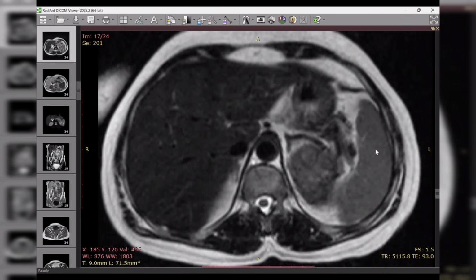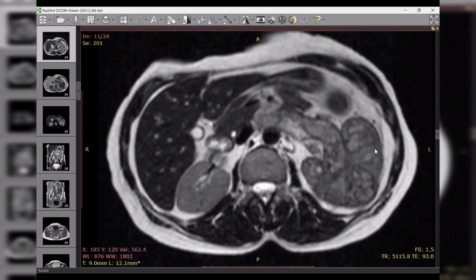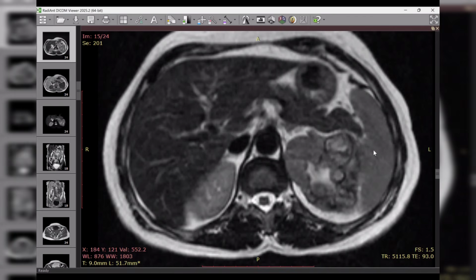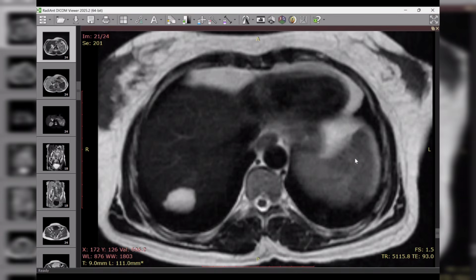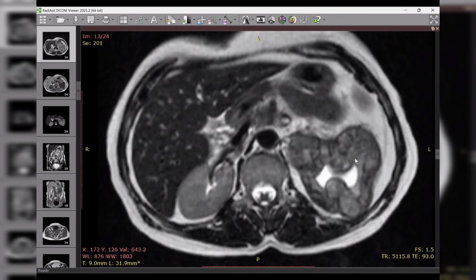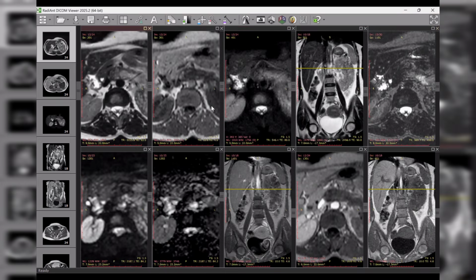These masses are suggestive of some neoplastic disease process, such as a primary neoplastic mass lesion, or it could be due to some infiltrative disorder such as lymphoma. I will also see the coronal images and the T1 images. Okay, can you give me the scroll, if you please, for one second? This is the T1. You can scroll.